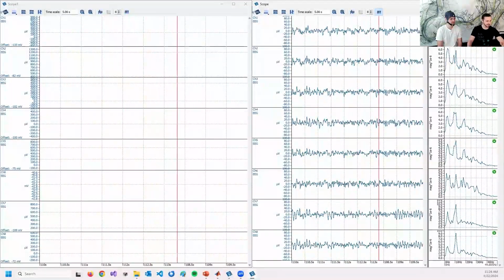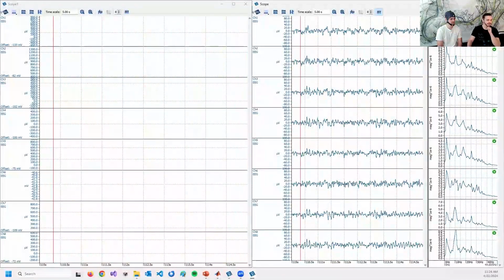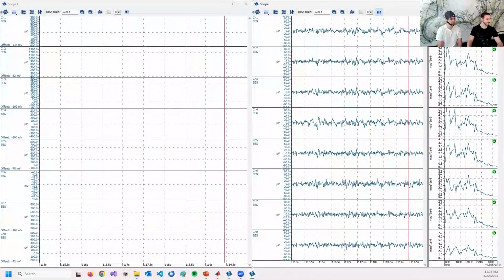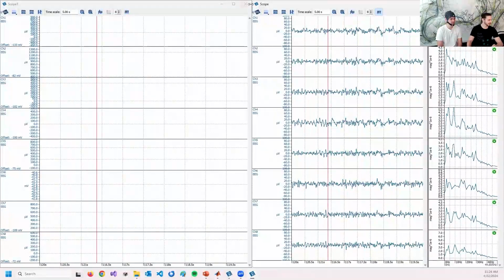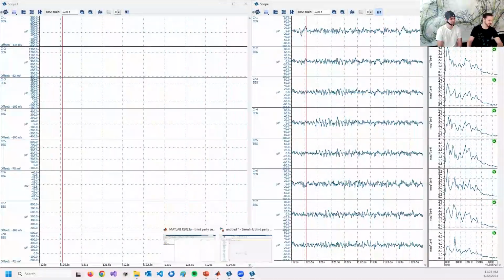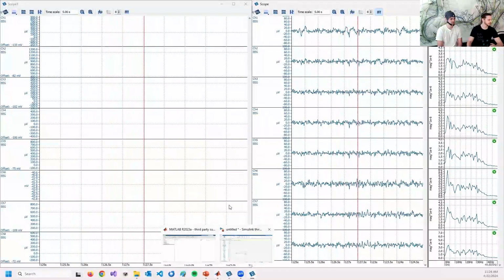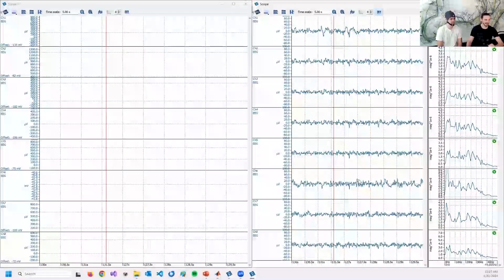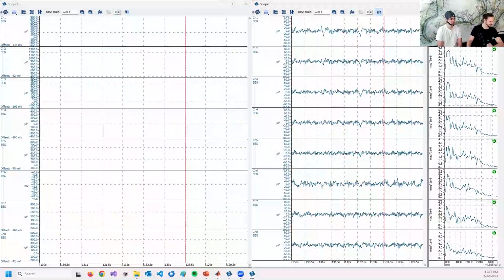And we can see the 10 Hertz peak is perfectly visible in the EEG frequency spectrum. That's cool. Within 10 minutes, we set up the data acquisition system. We applied some pre-processing filters and are running a BCI experiment already.